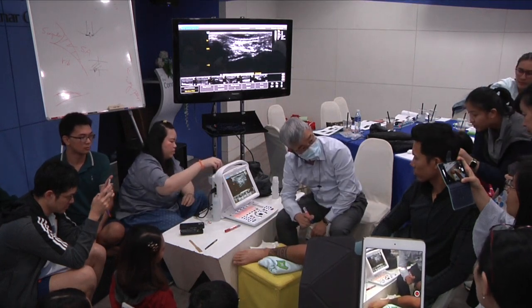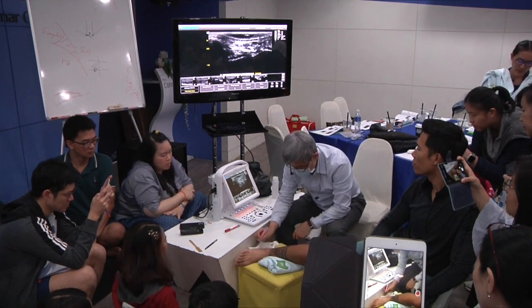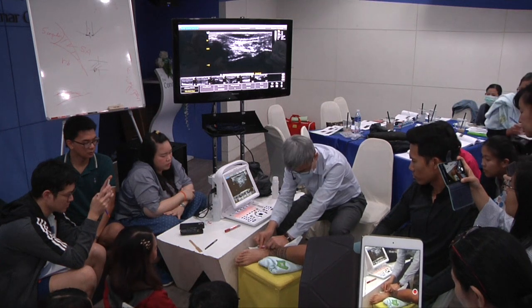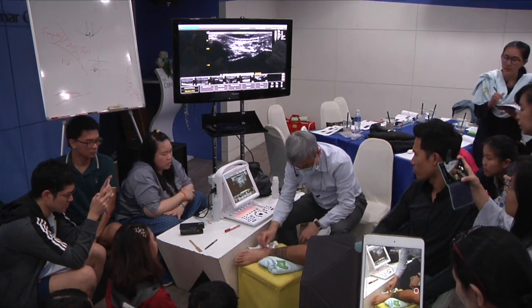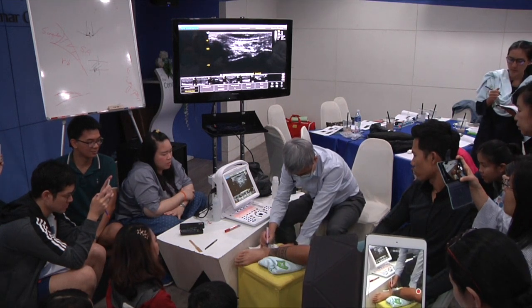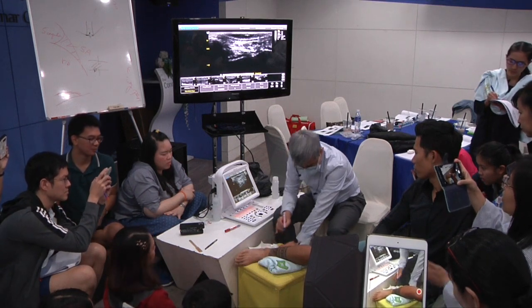ATFL. Okay. Slightly those. Yeah. Slide. CFL. Okay. PTFL.